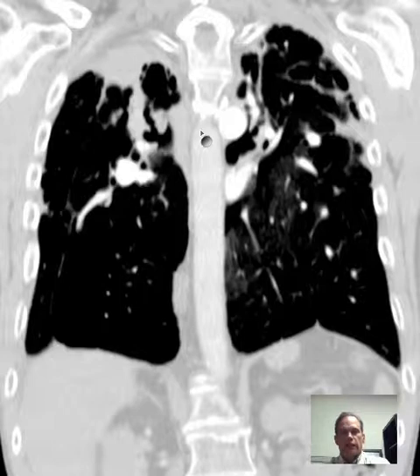is something that we see in COPD patients, particularly emphysematous patients, and actually it's particularly common in people who have inhalational diseases where they've been exposed to various substances, and the classic diagnosis that causes that is coal miner's pneumoconiosis.